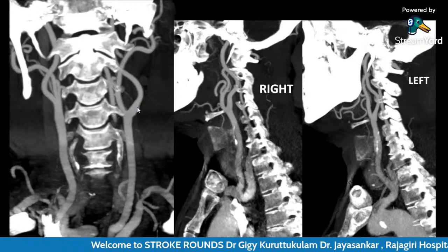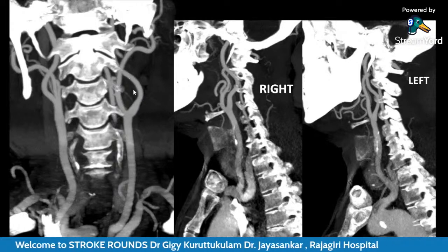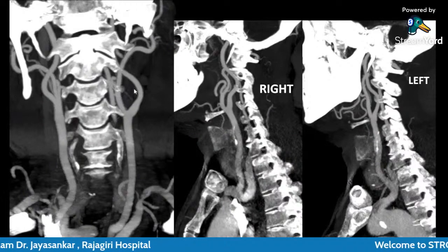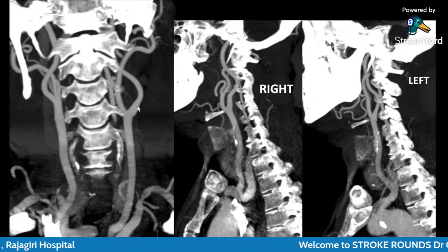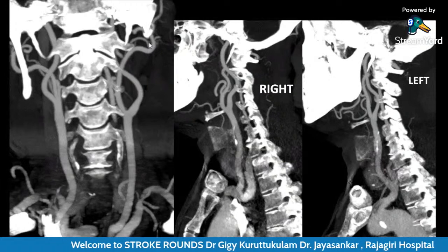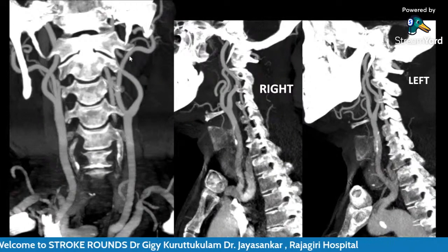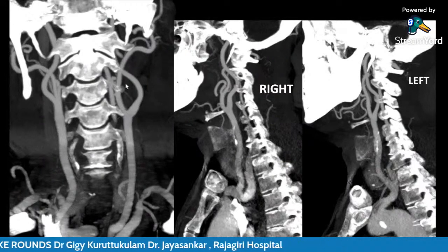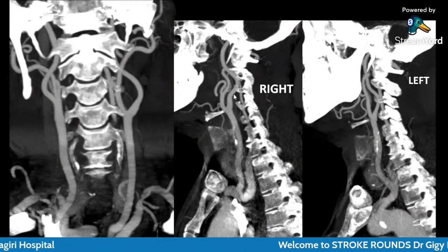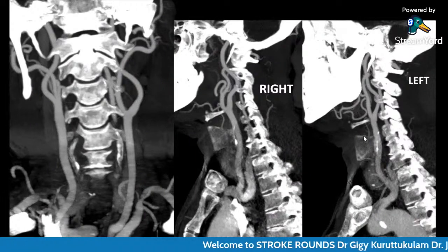So this is interesting, no? In the anteroposterior view, the internal carotid appears lateral and the external carotid appears medial. You should remember this, especially while doing an angiogram. What appears external is actually the internal carotid. External carotid means it is going outside the cranium. That's all. But location wise, this is exactly how it will look on angio also. So in the lateral view, you can see the internal carotid very well. There is no significant disease there.